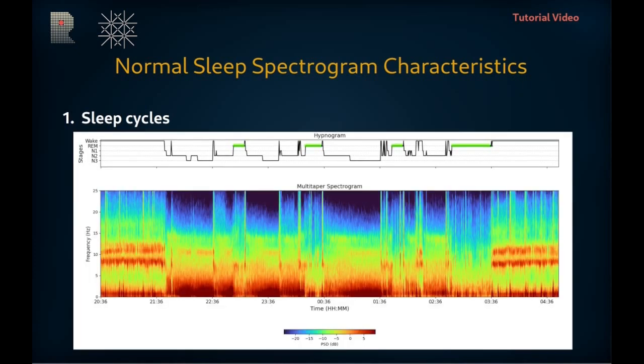Without knowing much about the spectrogram, we can already observe repeating motifs throughout the night that correspond with wake, non-REM, and REM. Among different patients, they present heterogeneity in the spectrograms. Nevertheless, they share similar patterns for each of the respective sleep stages.